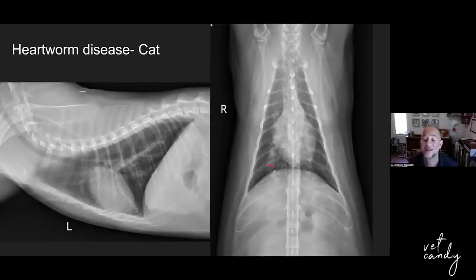And if you've gotten anything from this lecture so far, remember, veins are ventral and central. The arteries are away relative to the bronchus. So on the VD view, the artery is lateral to the bronchus. The vein is central. Harder to do for the laterals on this. We'll have to compare it to other exams, but it's something like artery would be up here and vein would be ventral further down. Okay.